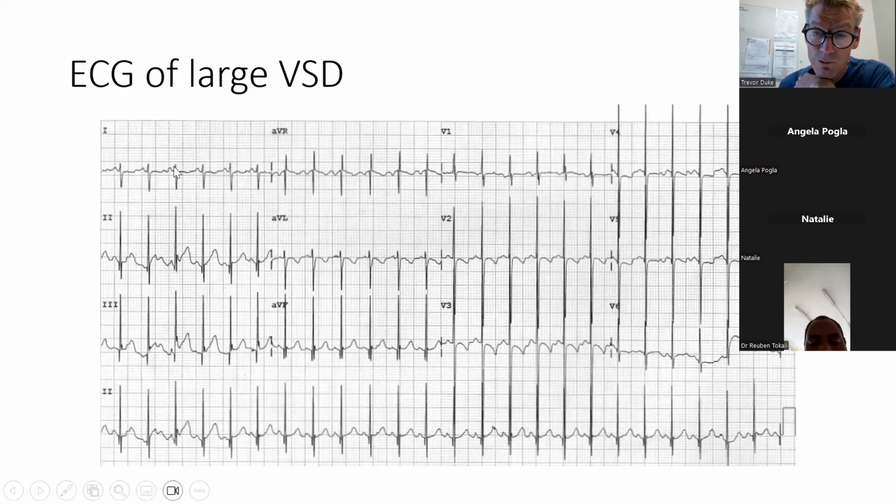The second thing we look at is the PR interval. Here you've got a PR interval of 1, 2, almost 3 small squares, so the PR interval is no more than 0.12 seconds. Remember, we said that the PR interval should be less than 0.16. We need to look to see whether it's in sinus rhythm or not.